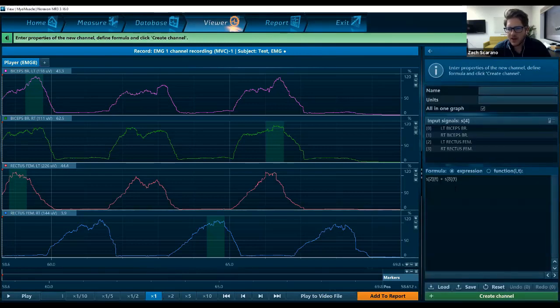And just to keep it rather simple, maybe we want to add two of the signals together to create a sum signal, for instance. So in this case, I'll go ahead and clear this expression out, but we can double click, hit plus, and double click on the other biceps signal and get that sum signal between the two options here.